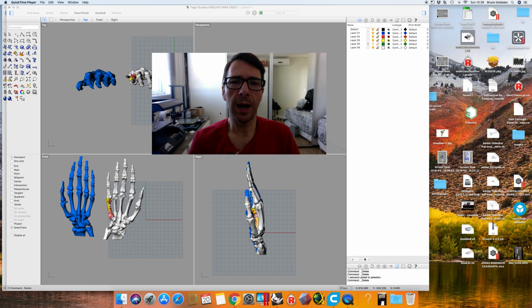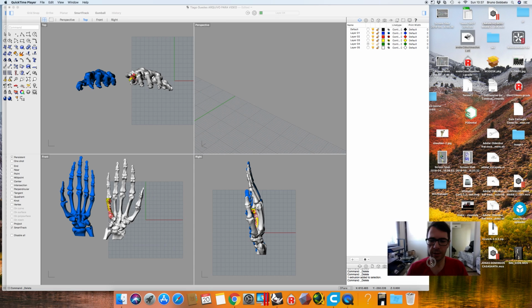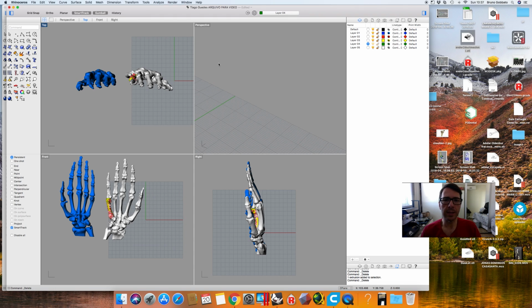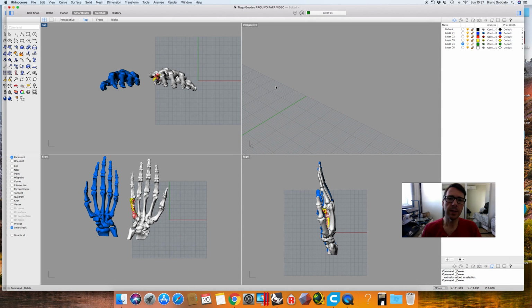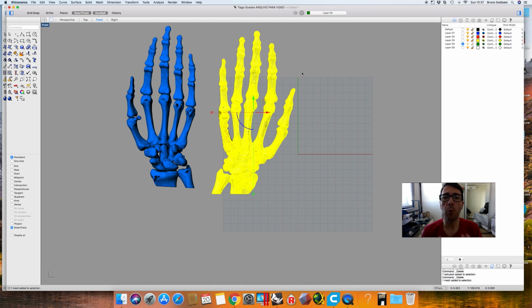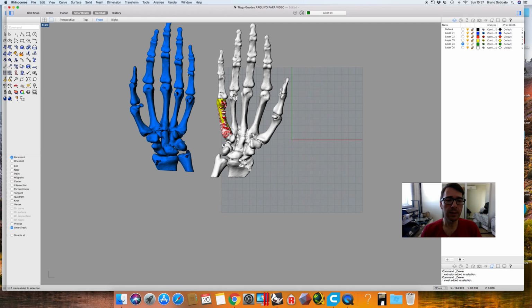Okay, I'm going to open here my 3D software. Let's put this webcam a little smaller, and here we can see, so we had a CT scan from both his hands. Okay, the problem is in the right hand. So we have here, if you can see, in white, I'm just selecting the right hand that has the problem, and in blue we have the left hand.